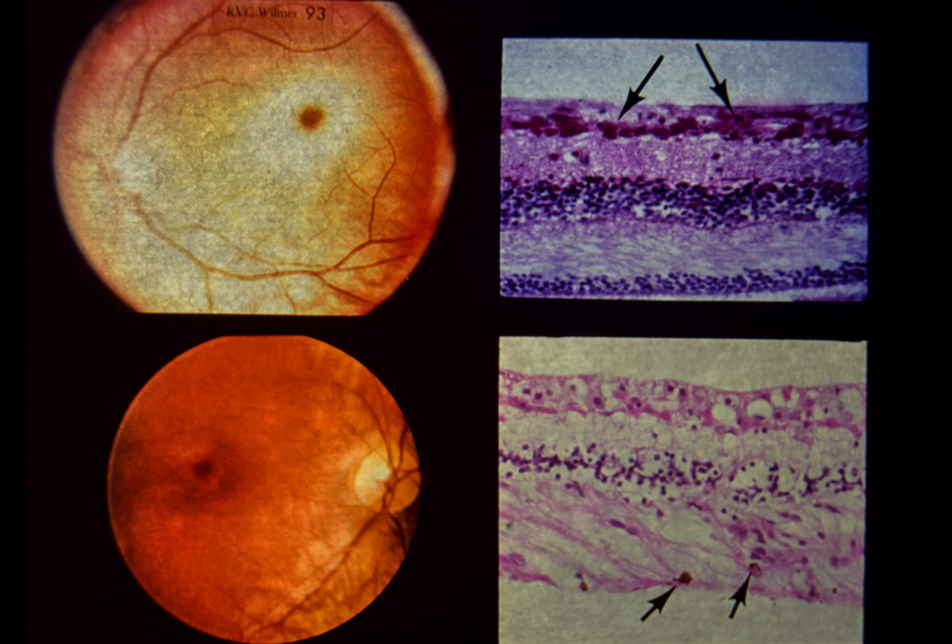You have now completed the text of the ocular fundus in neuro-ophthalmologic diagnosis. The next 7 slides will test your knowledge regarding this subject. A brief clinical history will be given for each slide. You will then be asked several questions. Write down your answers. After slide 100, return to slide 94 for a discussion of these cases. If you missed any, you may wish to review the appropriate section in the text.